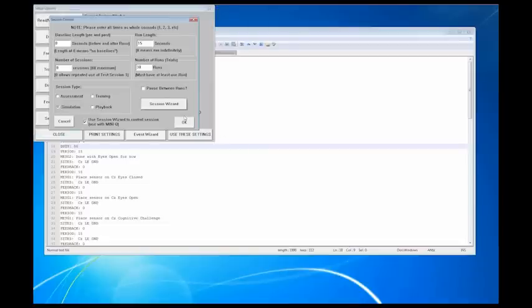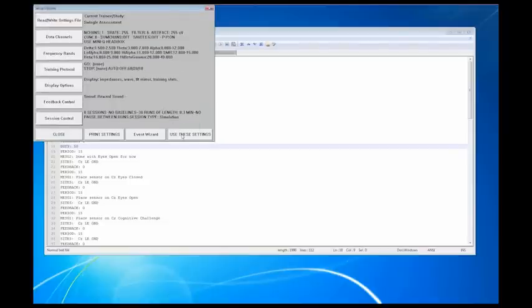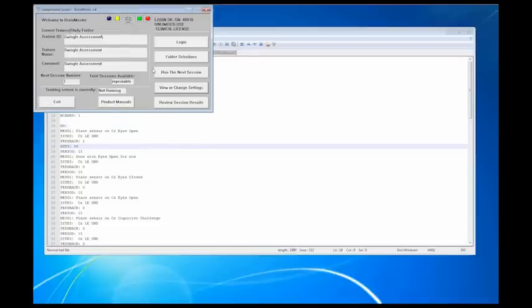The reason I'm reloading it is because I made changes. When you make changes and you don't load it in, it's not going to pick up on those changes. It's just going to play it as whatever it was before. So you always need to make sure you reload that .mqt file into your protocol, or it's going to always act the exact same way. I'm going to get a phone call, and we're going to have to work through it, and we'll get through it. But always, as a heads up, make sure you reload the .mqt file.